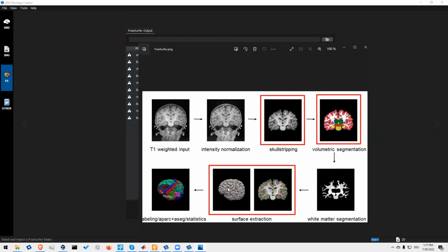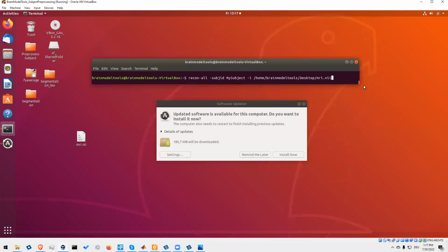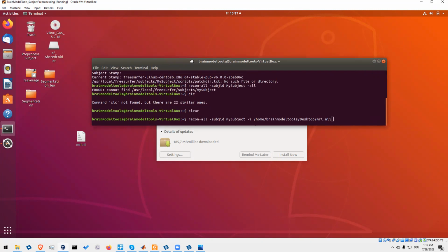Like you can see here, one output is, for example, a really accurate and nice 3D model of the cortex. And you even get these anatomical atlases where you can see the gyri and so on. So it's pretty nice, but it takes many hours to process. Like you can see here, it's only available on Ubuntu and Mac OS.